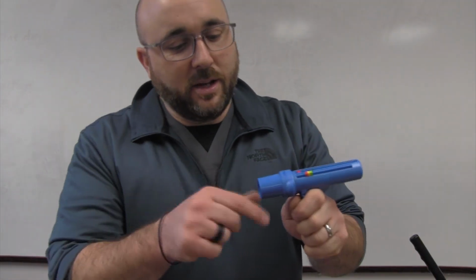So what you need to do is this for at least probably a week to find your normal peak flow. In the morning, you're going to do three and take your best. So with peak flow, you've got to blow fast, really fast. We're measuring speed. It's going to look something like this. The handle is nice. You can have a mouthpiece on there. In this case, I'm not. And I'm going to blow.